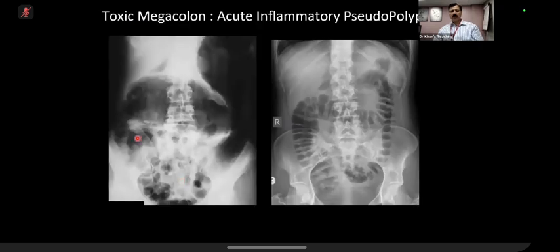And this film you had done in your plain abdomen, so I'm not showing you plain films today. Having said that, I just wanted to make that point. If you see here, this is a normal abdomen. Look at the transverse colon, look at the crisp and sharp outline of the haustra.